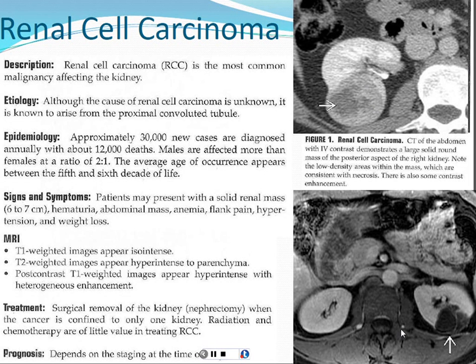This is an MRI example of one that is a little bit trickier. This one looks a little bit low signal intensity, like you would expect a cyst to. And likewise on T2 weighted imaging, this would be mostly homogeneously bright in here. But you look for these septations, and you notice that they're enhancing as brightly as the kidney does, and that's a worrisome feature. So sometimes these can look like a complex cyst, but once you see something that breaks enough of the rules, like having an irregular border and having a thick septation that enhances, or having any nodularity to it, you have to become suspicious of one of these renal cell carcinomas, because they can sometimes look cystic.